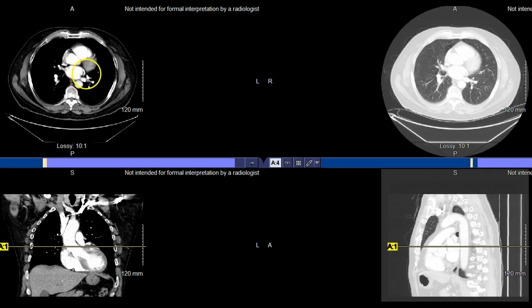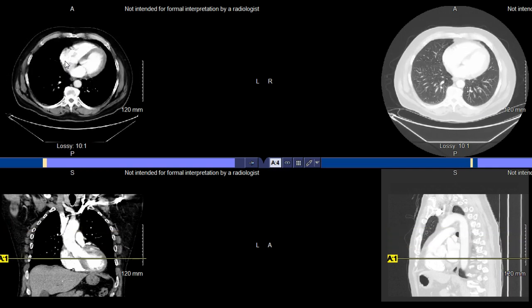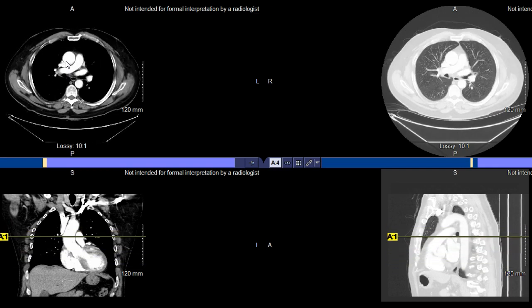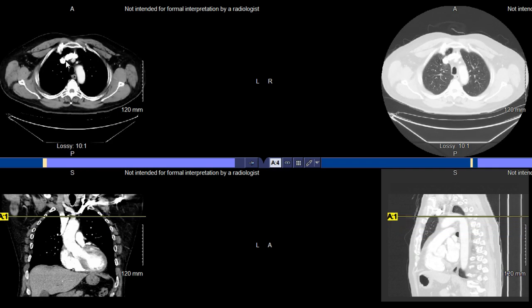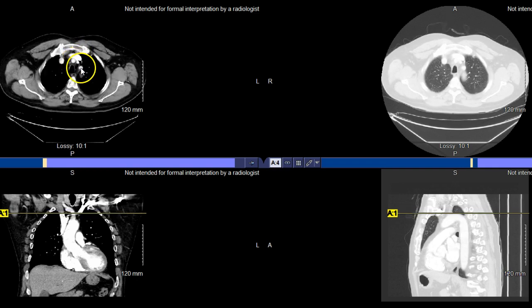And you can see the left atrium kind of hanging out over here. Again, it looks a little bit different than what we tend to expect. The true right-left sides are a little bit skewed when we're looking at the heart, just based on its given and respective orientation within the body. So other structures, let me just go back to the superior aspect here, so we can follow some of these other structures down aside from the superior vena cava. So when we look at these structures here, our arteries, we're going to follow those down.